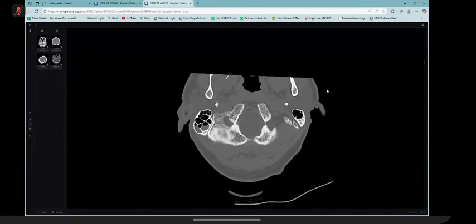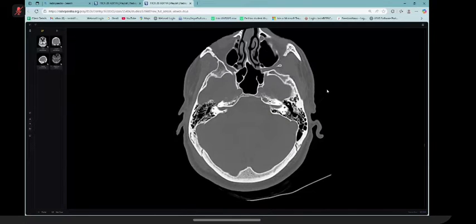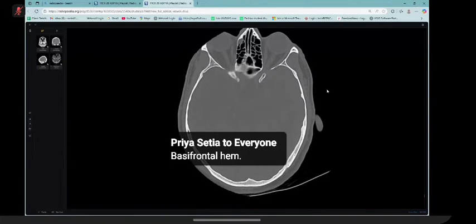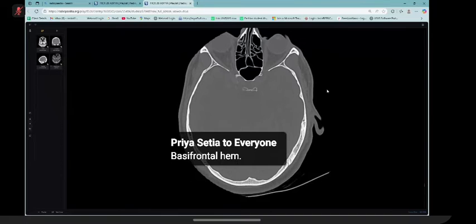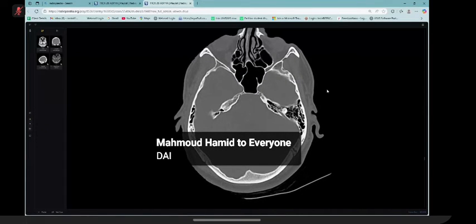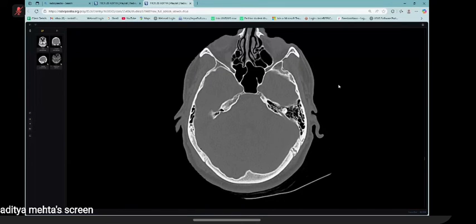I would like to look for any fullness in the orbital region, which is not seen. There is no evidence of any fracture. Sir, what are the other vascular studies, review areas? What are the various kinds of vessels you used to look at whenever you are assessing headache?